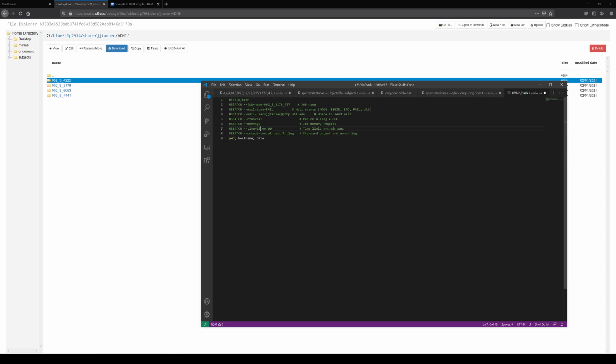And that's usually safe. There are some brains that occasionally, for whatever reason, it gets stuck doing some process and it's taking longer for the software to figure it out, for FreeSurfer to do what it's doing, and so it can take longer, but 20 is usually a safe bet for this level of data. And so that's fine for now. So 3 gigabytes of RAM, which is usually enough, sometimes 4. 4 would be safer. 3 or 4 is okay though.